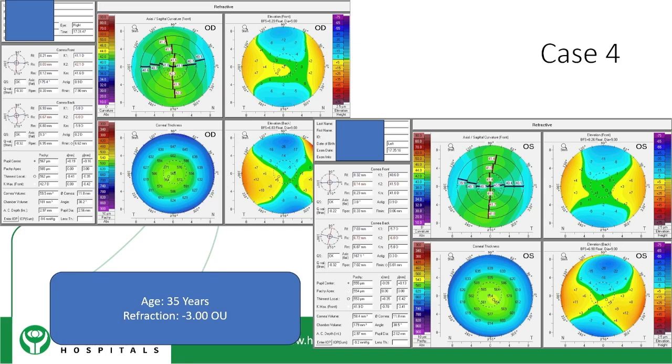But when you go back and see the Pentacam images and the Scheimpflug images, those Scheimpflug images are actually abnormal in the sense that it didn't segment very well, because it didn't know where the posterior surface was, where the anterior surface was. If that is happening, then that is something you need to go back and see yourself. So the quality specification value is not necessarily the be all and end all. You have to see the patient on the slit lamp and then judge based on what you're seeing.